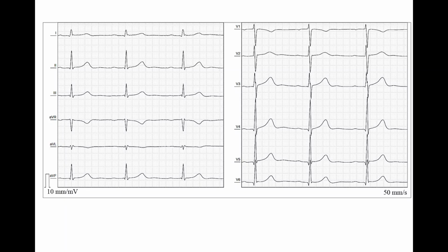If the ECG is recorded at a higher paper speed than usual, the P waves, QRS complexes, and T waves will look wider than those recorded at the paper speed of 25 mm per second. Sometimes it's more difficult to find P waves at higher speeds.